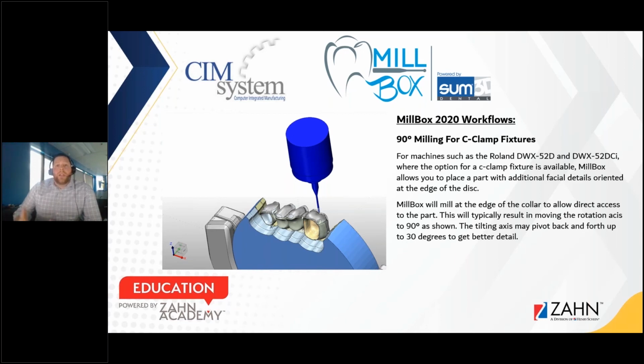Like I said, this feature allows us to nest units like this bridge that we see on screen here at the edge of the face of the puck. And that allows us to rotate the puck and mill on the facial surface. Since we know that the Roland mills have the spindle facing down, it allows the spindle to engage in those areas that it otherwise wouldn't be able to if you had the traditional style clamping system, or anything else that was preventing it, like a different angle or presentation of the spindle. So this is a great feature that allows us to do that.